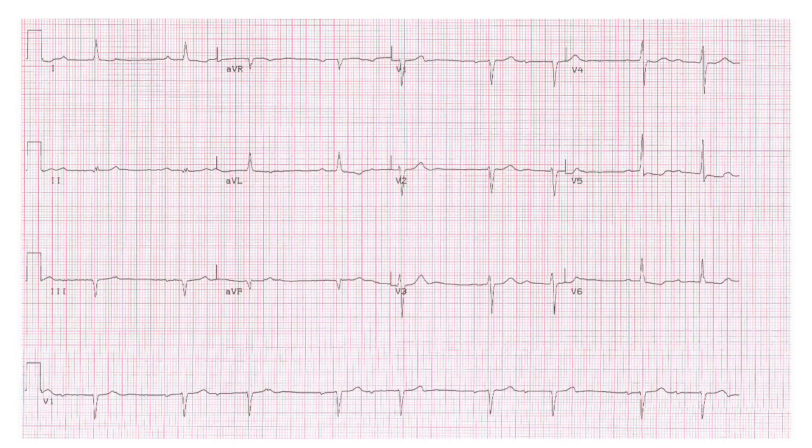So I've asked that first big question. I've got a regularly irregular rhythm, and I'm taking a look at my QRS complexes and trying to find the lead in which they seem to be the biggest and easiest to measure. And so I'm looking at V3. I think that makes it fairly easy to measure. And so there is the beginning of the QRS complex.